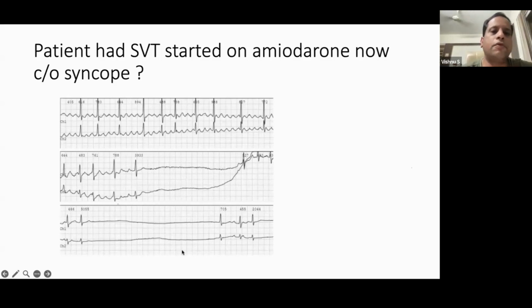This is another form of pause that can happen in a patient who was recently started on antiarrhythmic drugs and has a syncope. So this is a case you should know, because when you see syncope after recently starting drugs, this is a possibility usually.